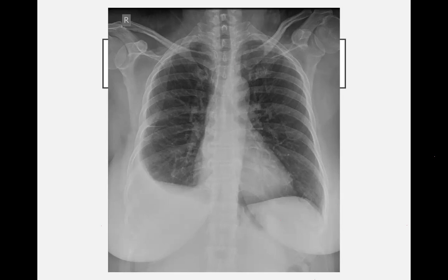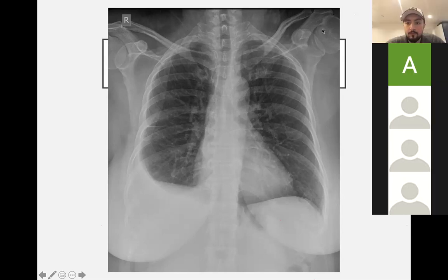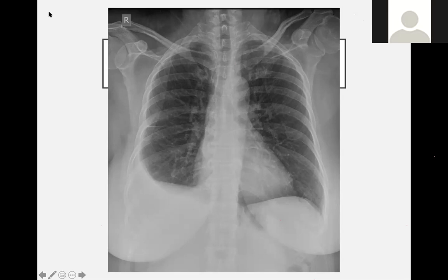I can see the vertebrae very clearly, and they go behind the heart as well. So I can see the ribs and the vertebrae very clearly. So that tells me it's very well penetrated, and it's not over or underexposed. It's got good exposure, this X-ray. Okay, in terms of the actual findings, airway seems central throughout, I believe.